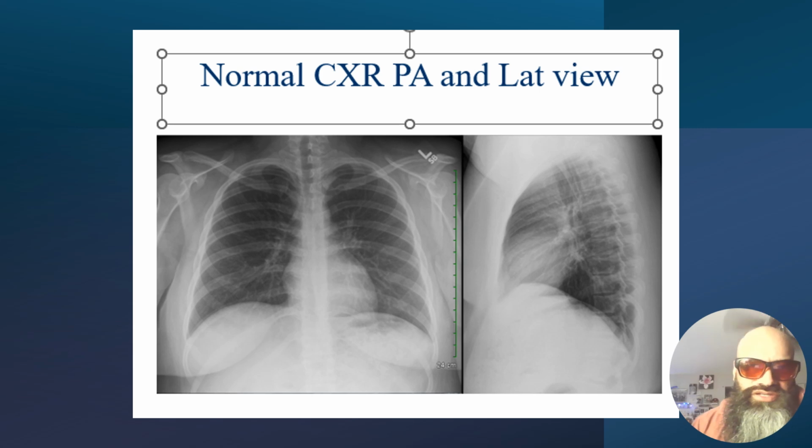The lateral view is taking the patient in profile. They are ordered routinely, like I mentioned in class. We just don't order one view. We order at least two, sometimes three, sometimes four views to help us localize any lesions that may be hidden within the compartmental regions of the anatomical structures of the chest wall. But yeah, this is done in the profile view. So if we see something anteriorly, we can compare it and locate it on the lateral view as well.